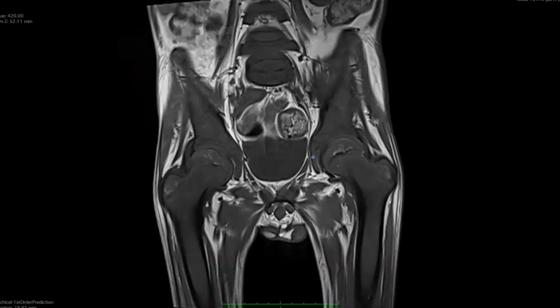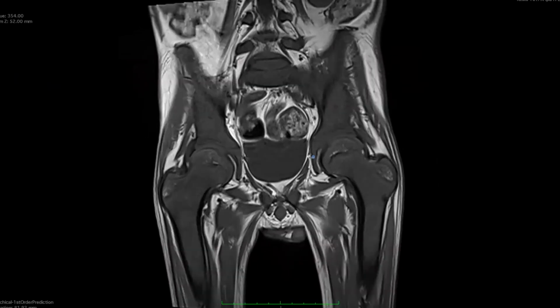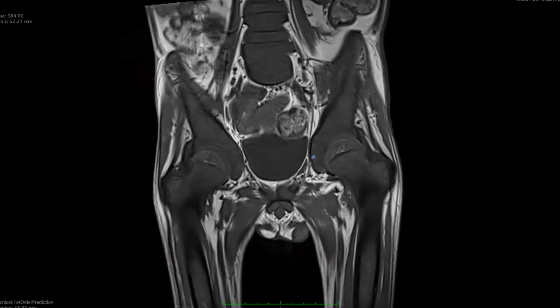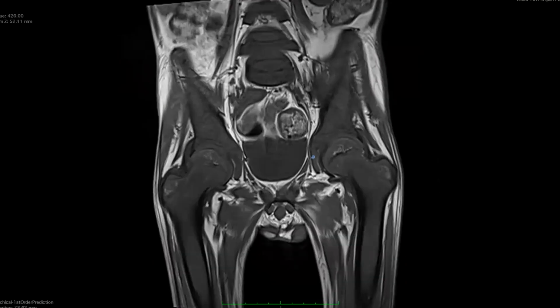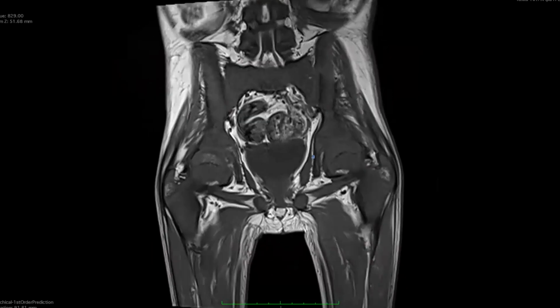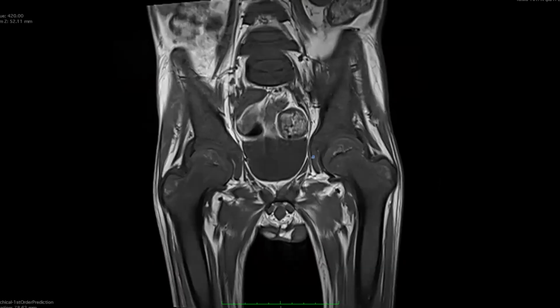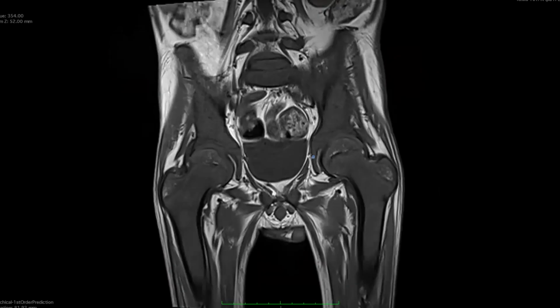The T1 weighted images reveal a complete loss of the fatty marrow that is supposed to be seen, involving practically all the bones. Even the bones of the spine show absence of fatty marrow. So there is a diffuse infiltrative process happening here. Apart from that, the visualized muscle appears slightly atrophic. The joint spaces, as I had seen on the STIR imaging, are also well maintained.